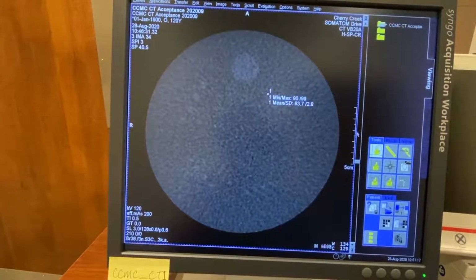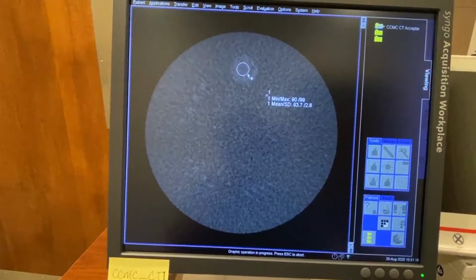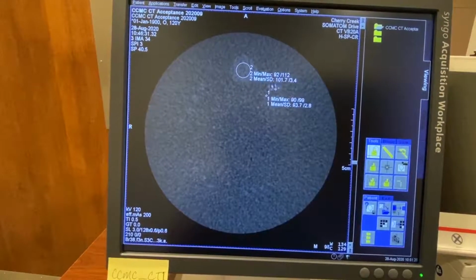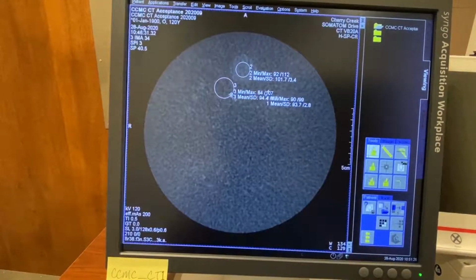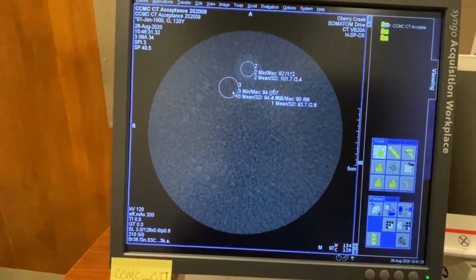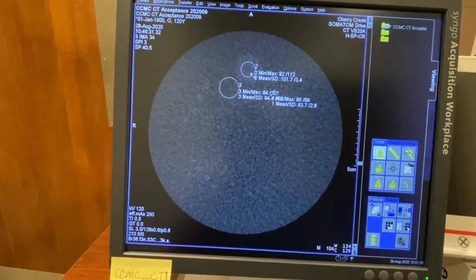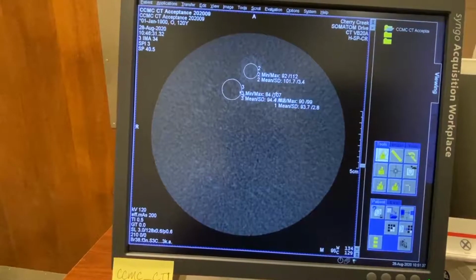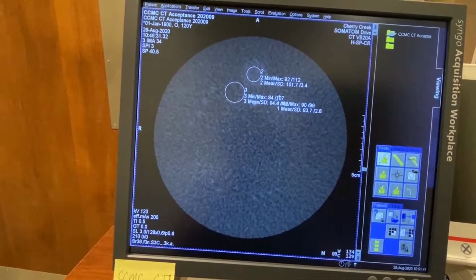So by measuring, this is a low contrast object. By measuring the mean and standard deviation of this object and the mean and standard deviation of the background, I can calculate the CNR or SNR of these objects. This is an indication of how much noise there is and how much contrast can show up.